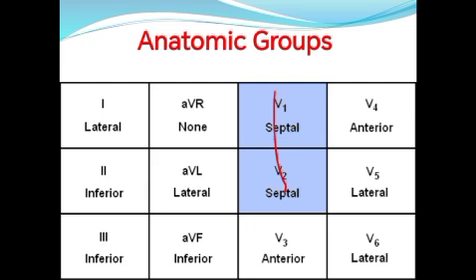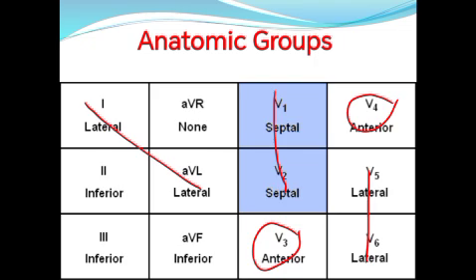For the lateral we have both lead 1 and AVL, and V5 and V6. For the anterior we have V3 and V4.